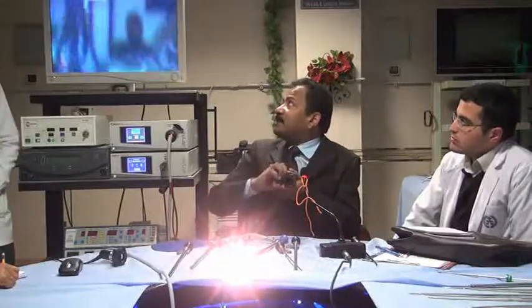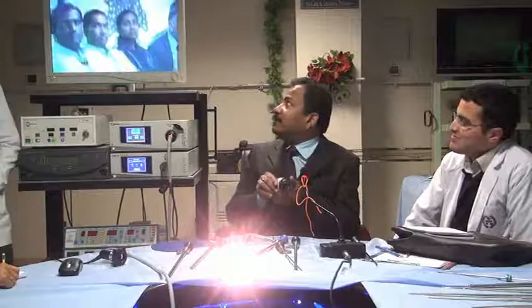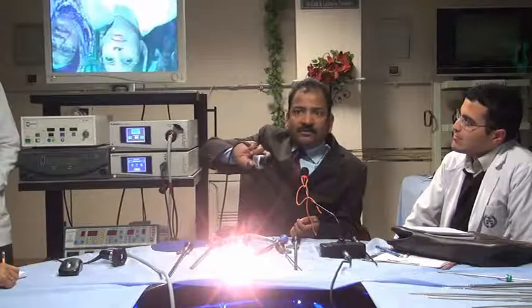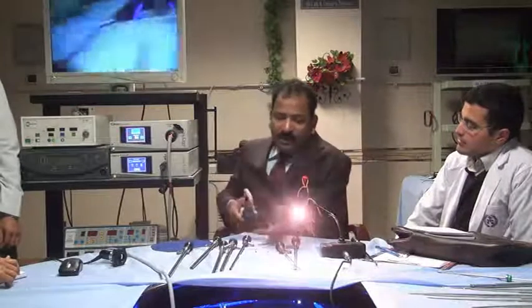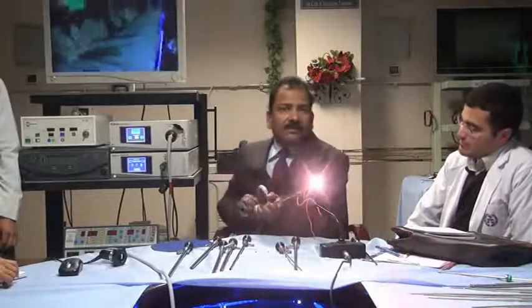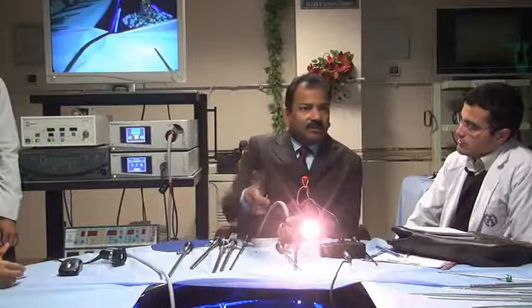Here, I will just focus it. This is the 6 o'clock position, this is 12 o'clock. If I rotate it, everybody's head will be upside down. So you are not allowed to rotate this at any time. What you want to rotate is only the telescope, not the camera. If you hold it like that, this is the normal handshake position of our hand, so it will not rotate.